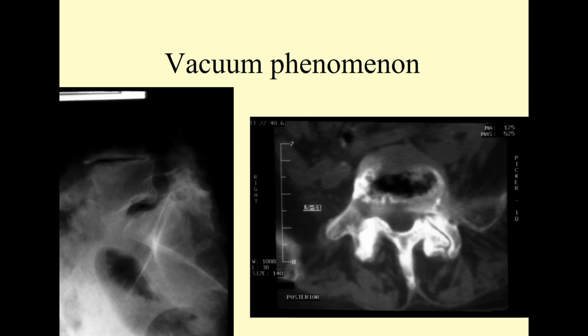Now, I don't see any evidence of lysis, but I would want you to know that the most common cause for anterolisthesis at L5 is spondylolysis, or bilateral pars defect. The most common reason for anterolisthesis at L4 is spondylosis. Now, for this patient, because we can see the pars area is intact, we are truly looking at simply a severe case of spondylosis, and that's producing the Wiltse type 3 anterolisthesis.